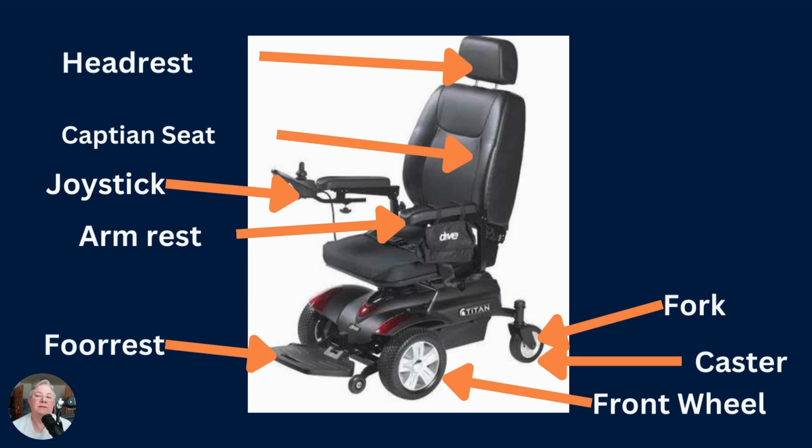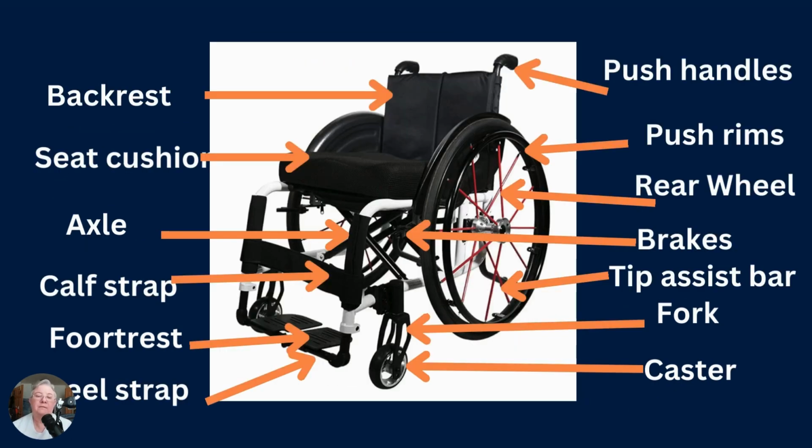So, this is the basics of the power wheelchair. Now we're going to go to the manual wheelchair, which changes a bit. So, let's see what we can do to unconfuse you. All right. As you can see, the manual wheelchair has a whole lot more.